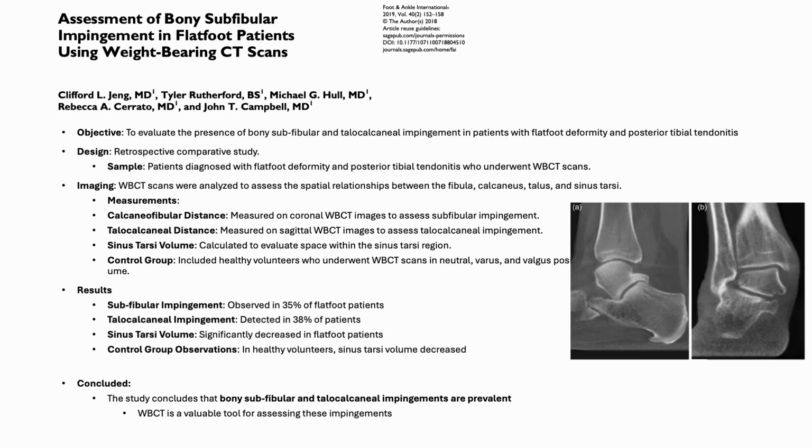We might miss these unless you're really tuned into this on your exam, so I really think you have to diagnose this and not just think it's peroneal tendon pathology. It might be, hey, they're getting impingement at the subtalar joint. They might have mild arthritis at the subtalar joint. They might just be getting impingement because of how bad their valgus deformity is, and I really enjoy this.